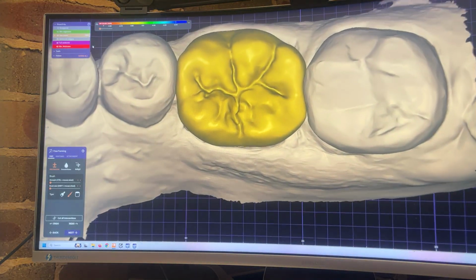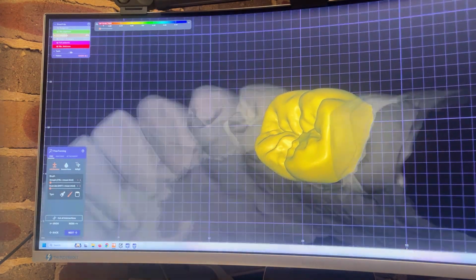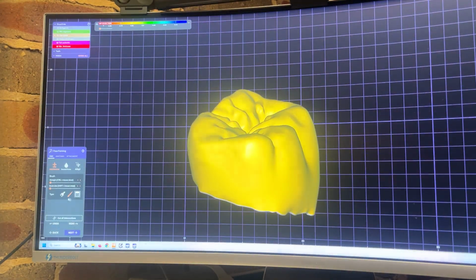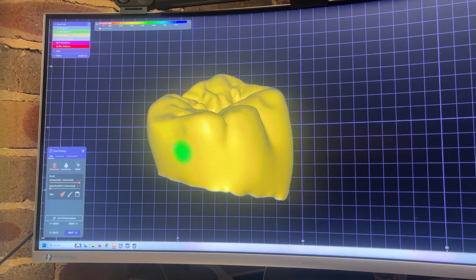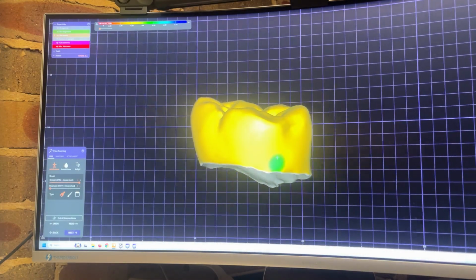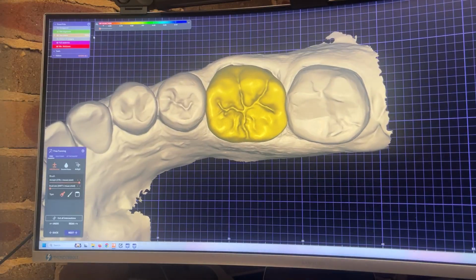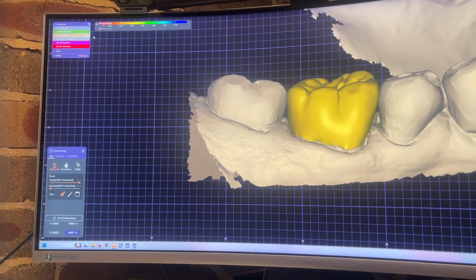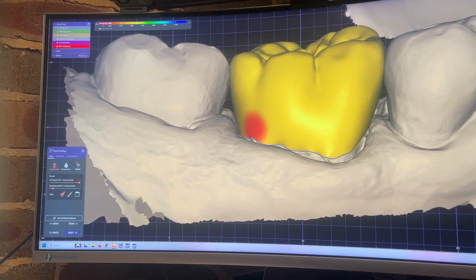Yeah, it looks funny there, but I think it's the best option. There, yeah. Let me just. And you gotta know the limits of the mill machine too, because the mill machine can't really mill out these undercuts in here. So have to be careful with that as well. It's gonna be a bit tough moving that out. It's a bit odd, this tooth, so I'll get some shape here. I want to thin this out here, just get a bit of shape going on. Curvature here too.